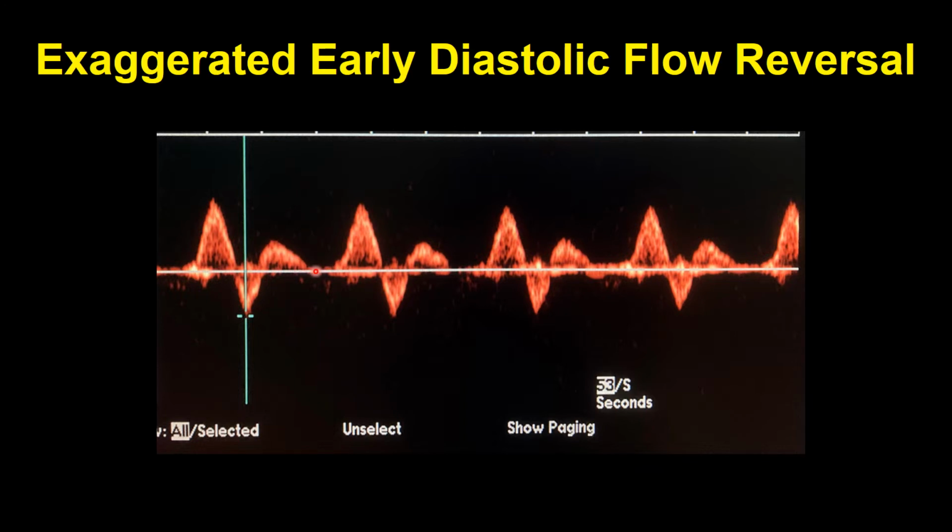And in my experience, this is typical of failing hearts, that it's due to the low stroke volume, and there's just not enough volume and blood flow in the aorta to hold the column of blood up, and so it falls backwards. Could be an important sign of left ventricular dysfunction, or in this case, the common ventricle, the single ventricle.